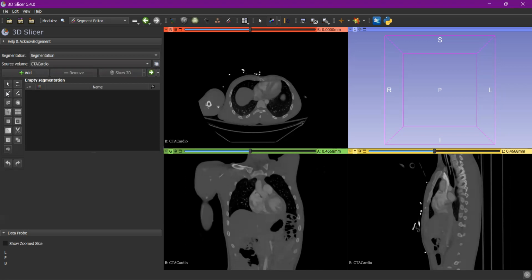And this is paint. Paint is generally used to select some regions by painting them. With draw, we can draw some annotations on the screen, which is not meant for the experimentation, just for writing's sake. With erase, we can erase the paint which we initially used and erase the drawing. Level tracing means we can trace the exact level of that slice in the three views.